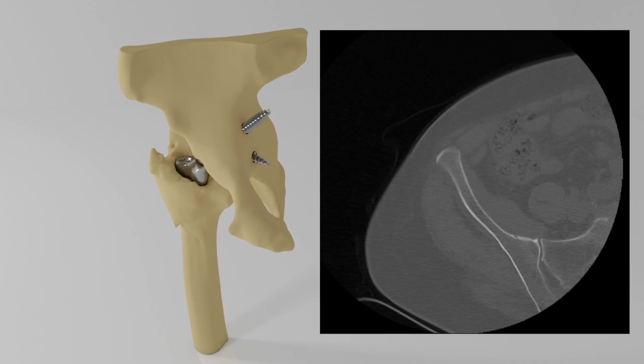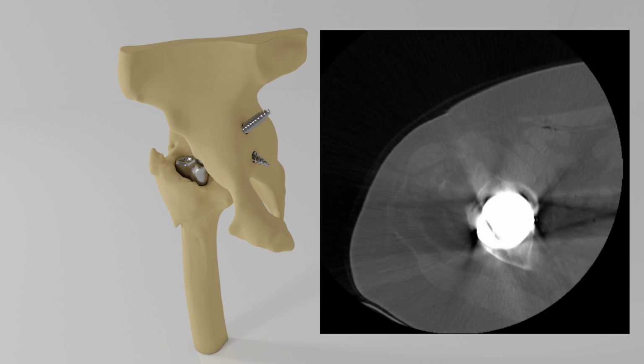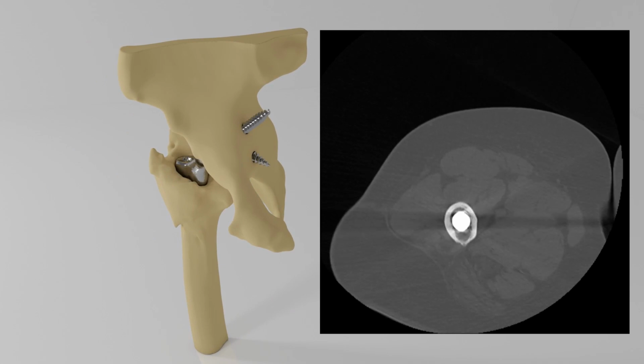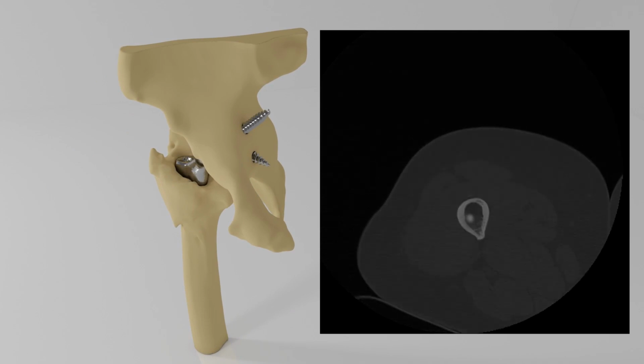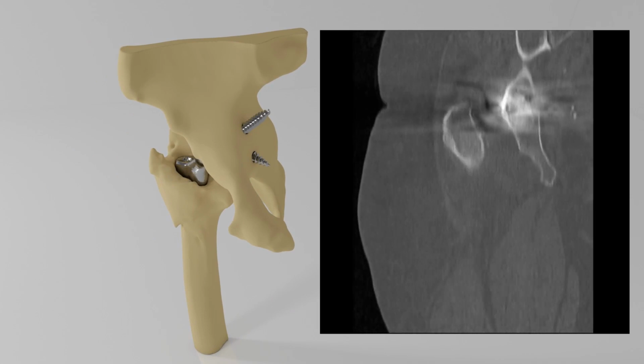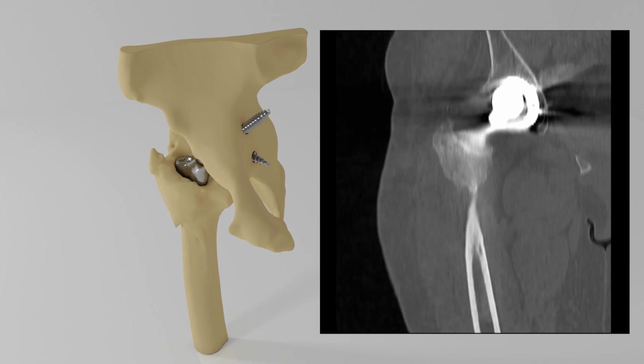The CT scan was provided by the hospital in DICOM format. It has a very low axial resolution of only 2.5 mm. It is important to understand that a model based on a CT scan can only be as accurate as the resolution of the scan itself.